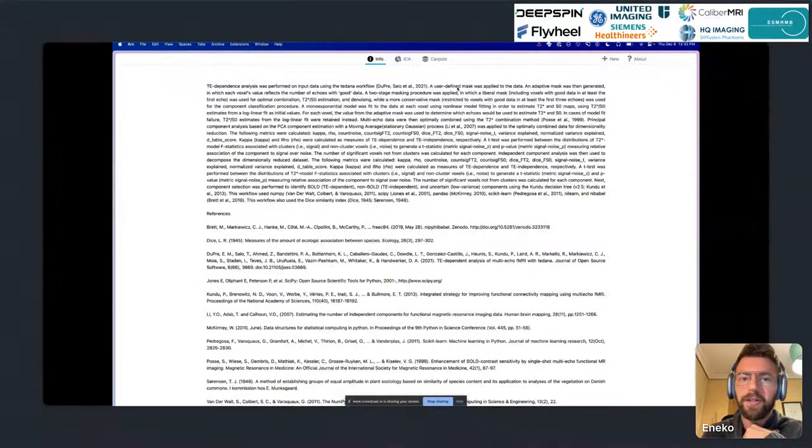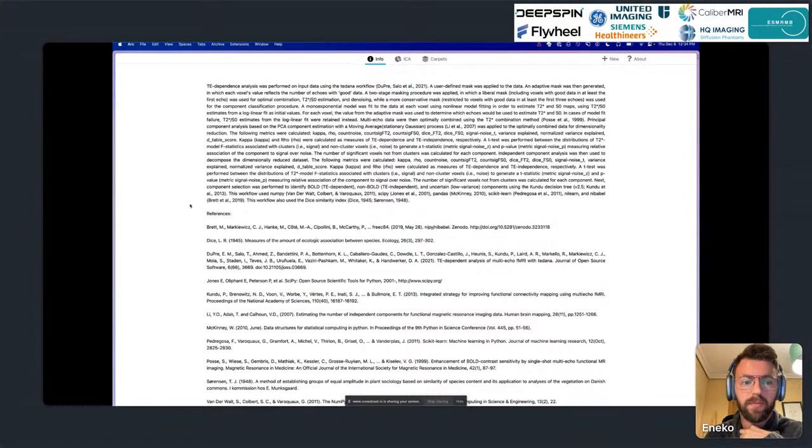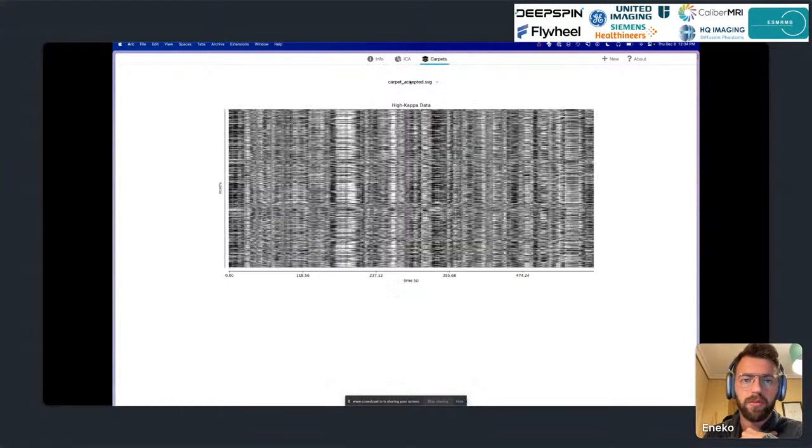So what you see here on the info tab is some information that TEDANA outputs as a TXT file, as well as some of the references to work that TEDANA is based on, or different packages that TEDANA uses. We also have the carpets tab with the different carpet plots.